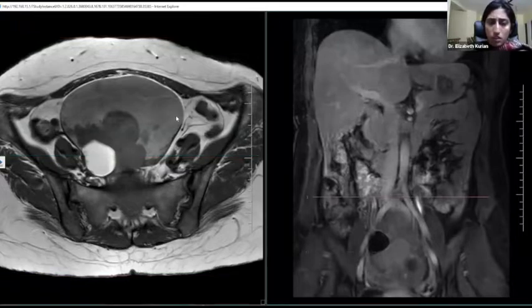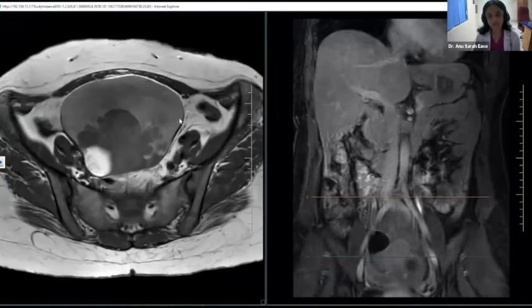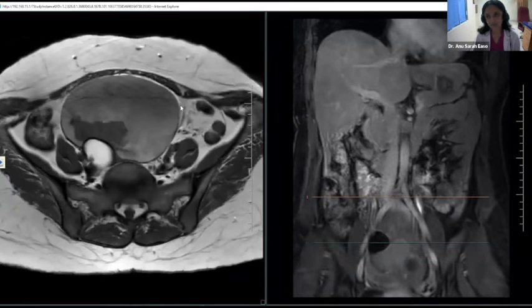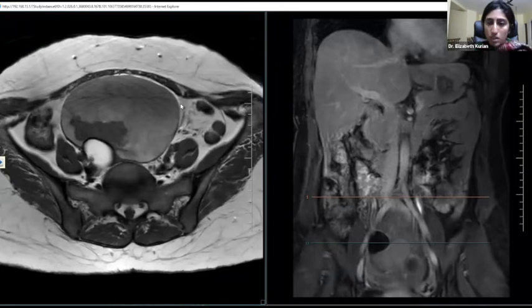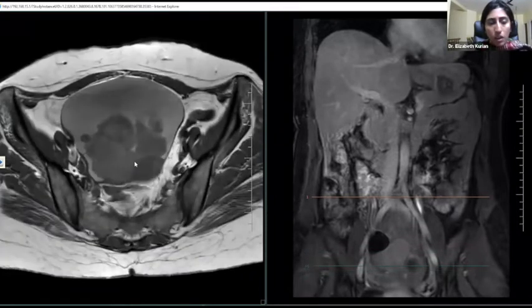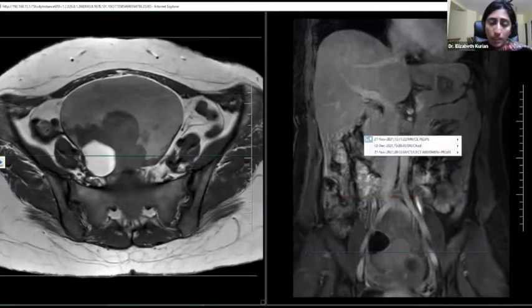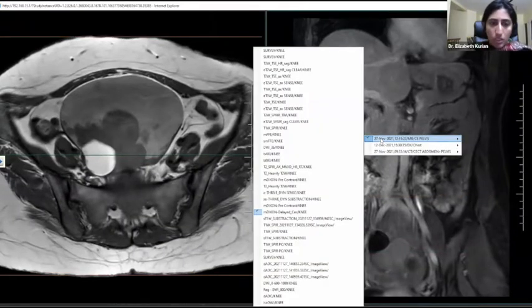Okay. So from the MRI, what do you think is a component of the lesion? As there are T1 and T2 hyperintense cystic parts in the lesion, the possibility of a fatty component, as I've not been given fat saturated images, as well as hemorrhage should be considered, ma'am.